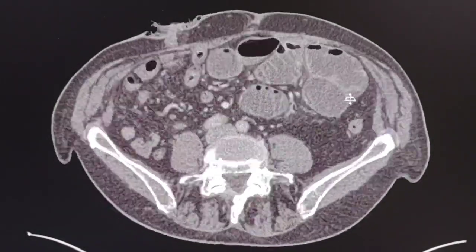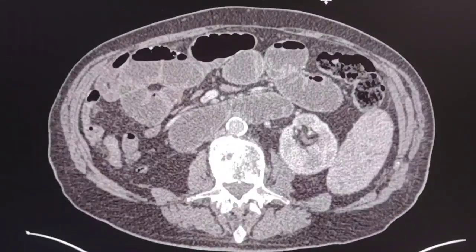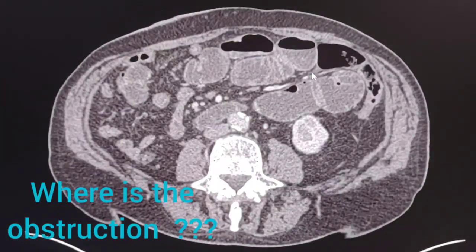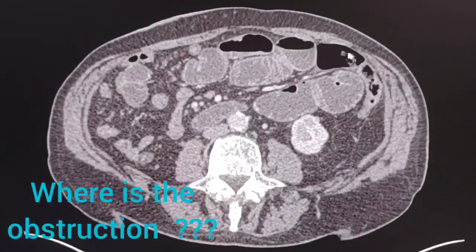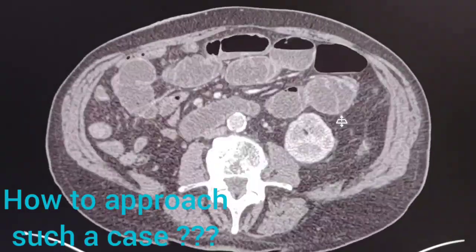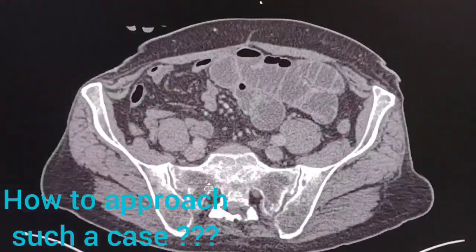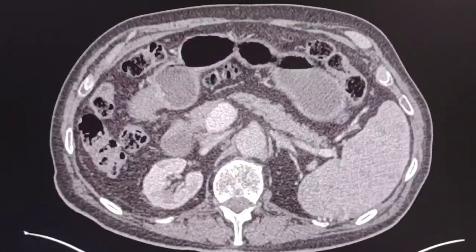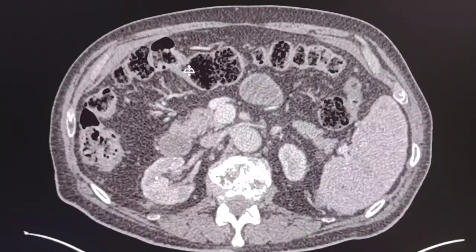Here is the descending colon. If we follow it and track it, we will see the whole large bowel here, here, here, the transverse colon.